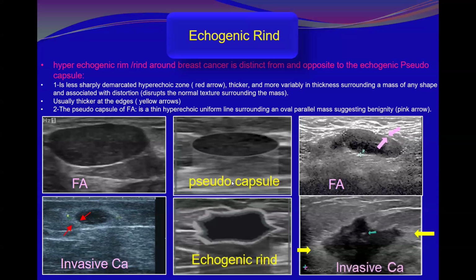You see? If you look here at this one, anterior and posterior, but look, see it here. Look at this one laterally. Look at the thickness of the hyperechogenicity. You have seen it here, how thick it is laterally compared to anterior and posterior. And even here, look at the hyperechogenic rim anteriorly, and this is all the thickness laterally. So in the lateral aspect, usually it is thicker.